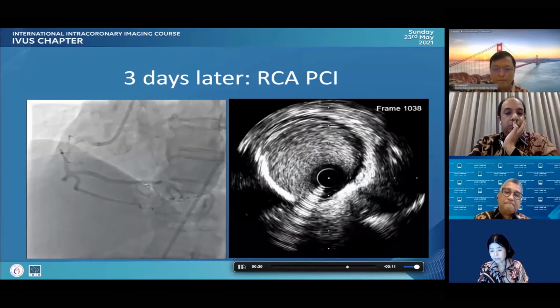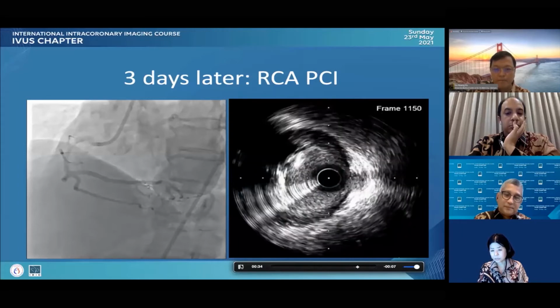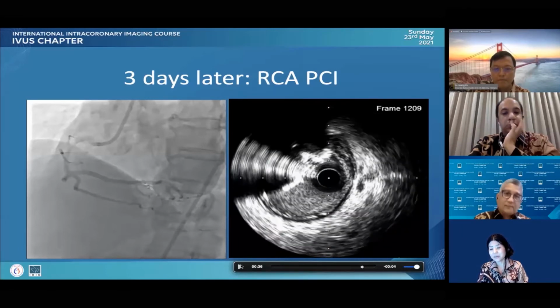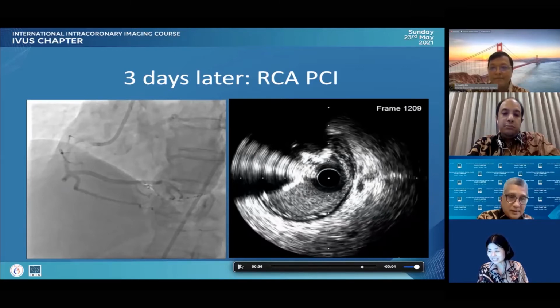Yeah. So you see the true calcified nodule, that's one, right? So really the wire location is on the top of the calcified nodule. So this is a really good sign. Your wire or rotablator may go to the top of the calcified nodule. That's it. Great comment. Please, Dr. Vu.